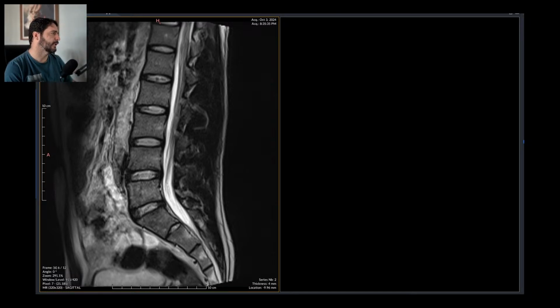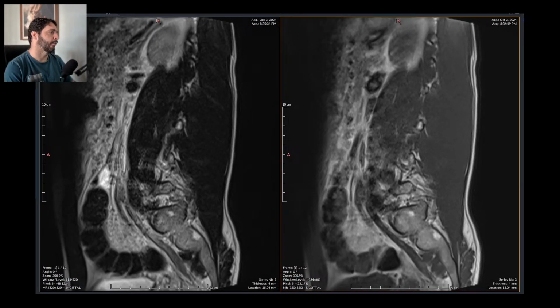So this is a 26-year-old male patient. He says, let's see what he said. Whatever he said, I can't read because it's badly written. Let's see what his doctor said. He has bilateral lower back pain. So bilateral lower back pain in a 26-year-old male. Let's grab a normal template for lumbar spine because it's most probably normal.